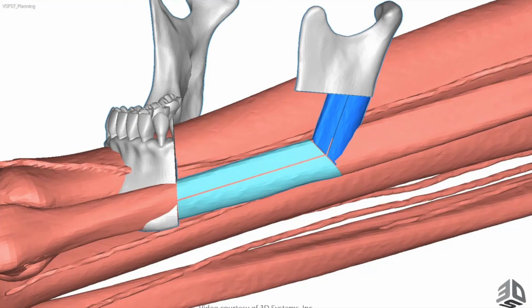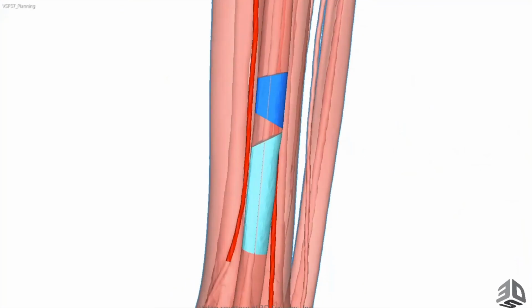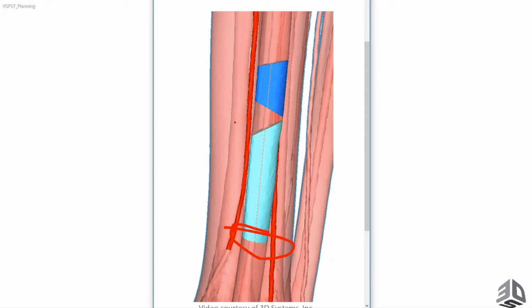So if I was to take us home then and see what those would look like in the position that you would be using the guide in, looking from the lateral surface here, we'd be looking at cutting slots here, here, here, and here. So the rationale for using the lateral cutting guides for me is that it gives me the maximum view of the pedicle rather than abutting the posterior surface. I get a better view of the pedicle, and I'll demonstrate that in some of the videos that you see today.